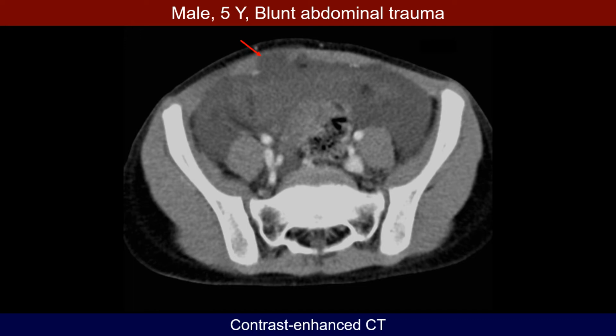Note at this level that some of the fluid is going well inside the right rectus sheath, and it is not possible for intraperitoneal fluid to do that. Extraperitoneal fluid, on the other hand, can do it, especially at this location below the arcuate line of the rectus sheath due to the absence of the aponeurosis of the transversus abdominis. So we conclude from this image that we are dealing also with extraperitoneal urine extravasation.